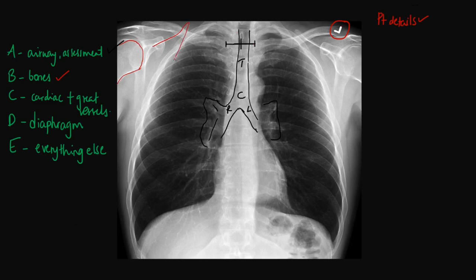Got the scapula, both sides here. Okay. Let's have a look at the ribs.